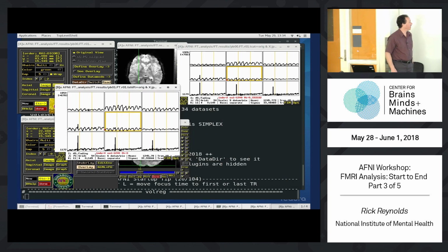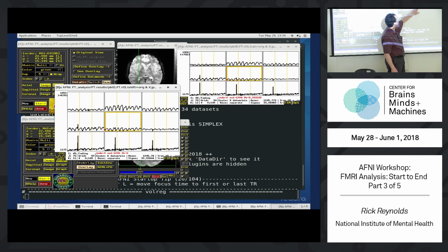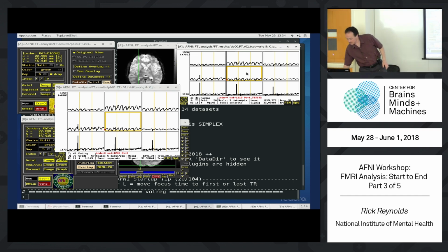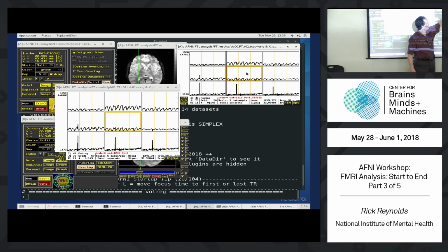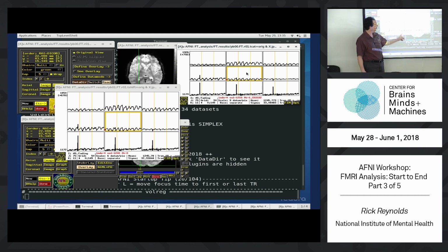You won't really see any visual difference in the data, except for example, looking at our data here, we remember this is time index 2. This is index 0. Let me back this up to time index 0 here. So time index 0 for the original data has value 1215 at time t equals 1.3 seconds. And now index 0 has value 1230 at time t equals 0.